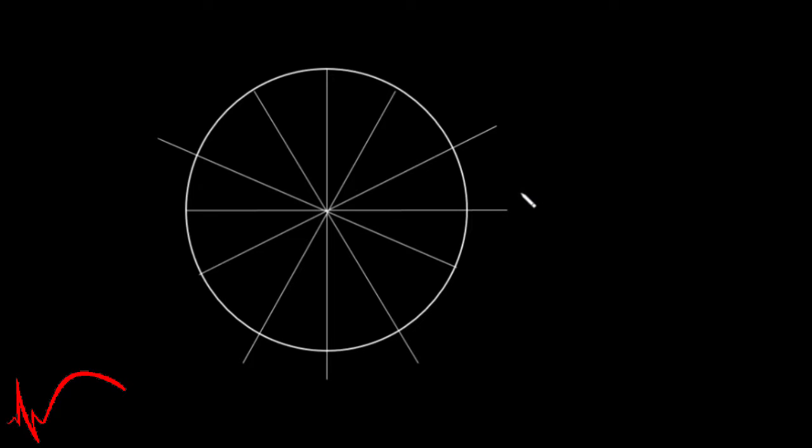So over here we have lead 1, which is a starting point of 0 degrees. You come down here, we get lead 2, which is 60 degrees to the positive. Down here we have AVF, and a value of plus 90.